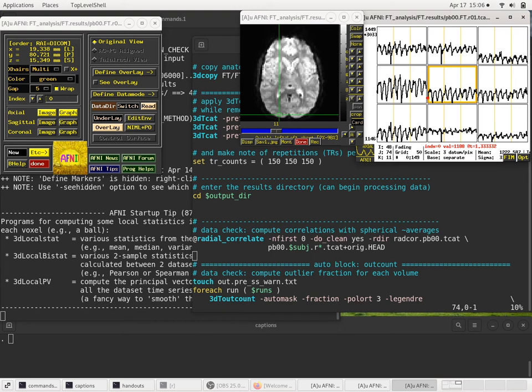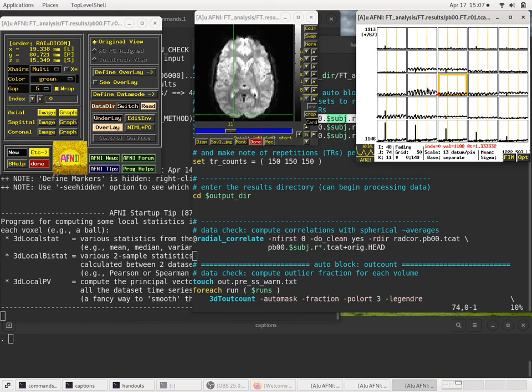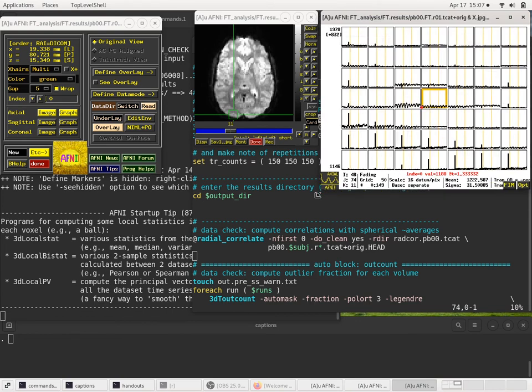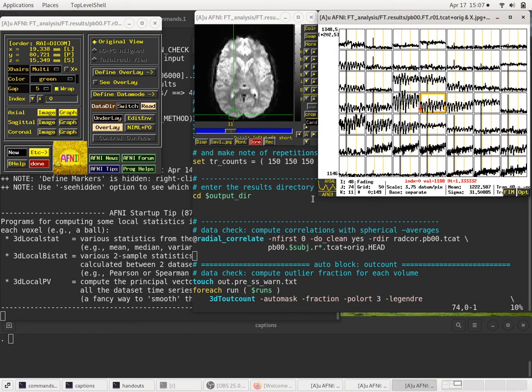But up here, even one voxel that's from here going that direction, this 3x3 grid matches the 3x3 grid in that box. Just briefly, I'll hit some capital M's for the matrix size, and make it bigger, or make it contain more voxels. I'll hit plus as well to make it taller.